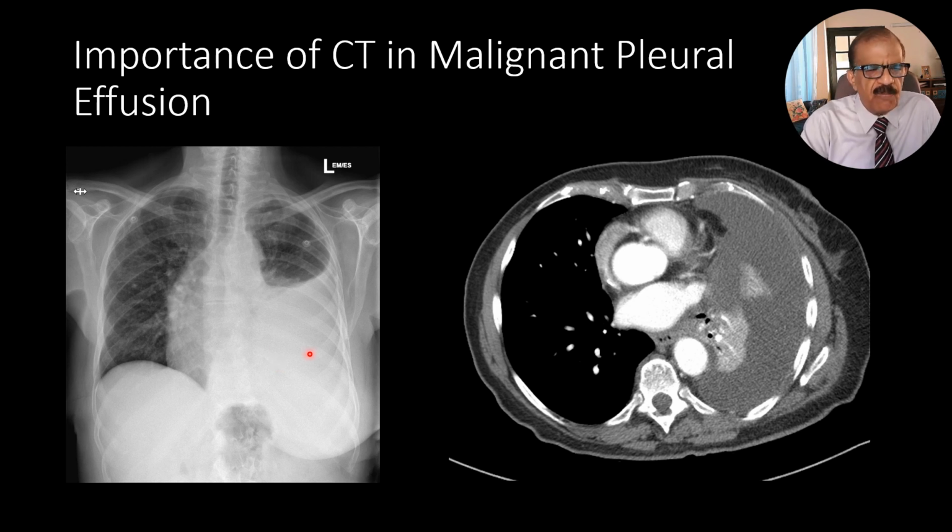This is just large pleural effusion. There is a possibility of malignancy, but we're not sure. Now if we do the CT scan, this whole thing and this whole thing I'm showing you, this is fluid, and this is collapsed lung, because when fluid accumulates, lung has to go somewhere. It comes to the hilar side and takes up this shape. It is slightly thicker, denser than normal, because it doesn't have any air, and these are the normal vessels. And these multiple white spots are all lymph nodes.